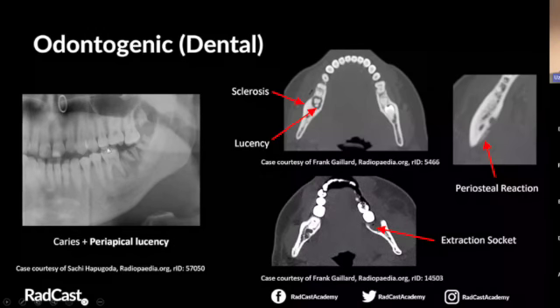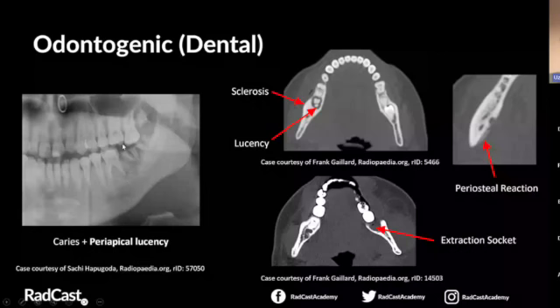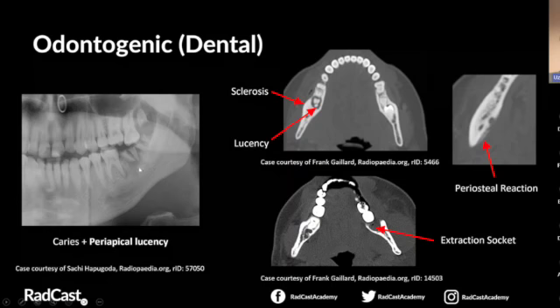So even though you can't see a massive caries in this tooth here, there is a periapical lucency. It's impossible to say whether that's an abscess or whether it's just some chronic dental infection. Here you've got another grossly carious tooth and a large periapical lucency. So if a patient presents and they're querying a dental infection, you would describe these lucencies, but that's the biggest and that's the most carious tooth. So you'd be thinking that's the most likely site of the infection.